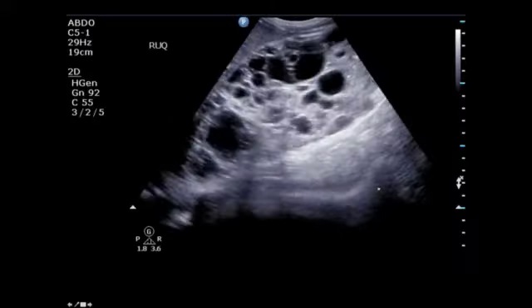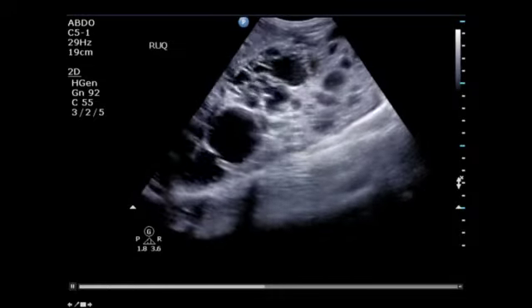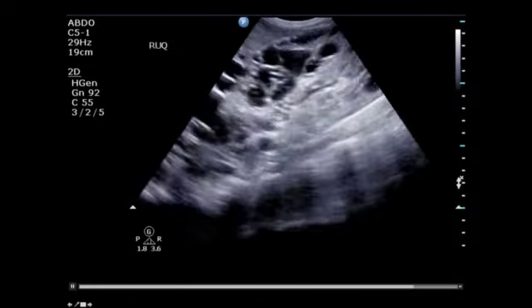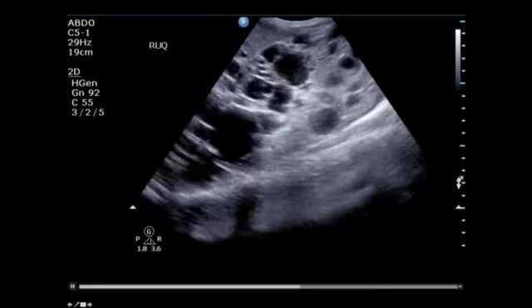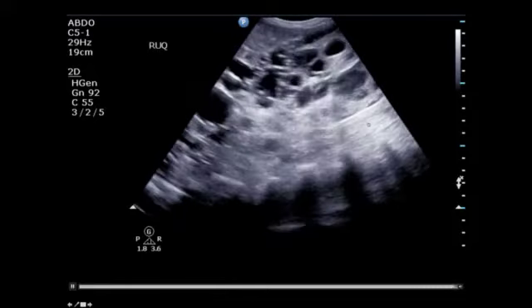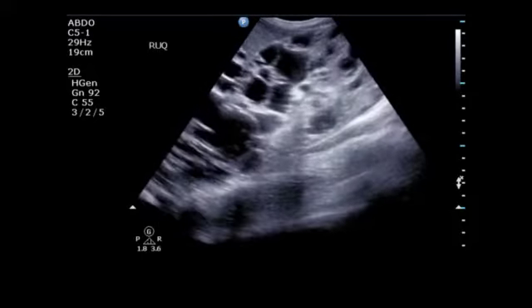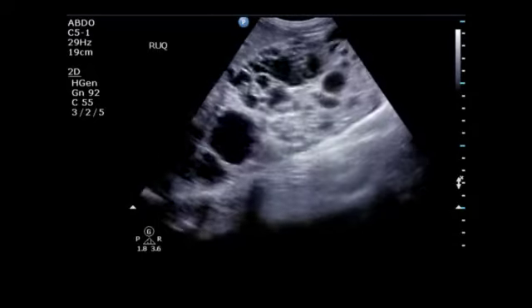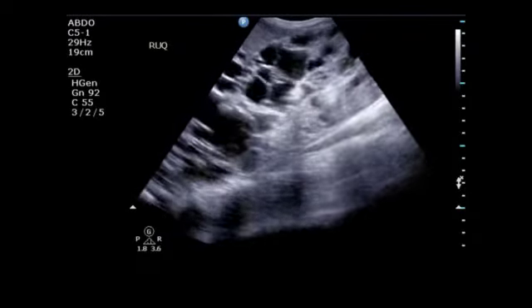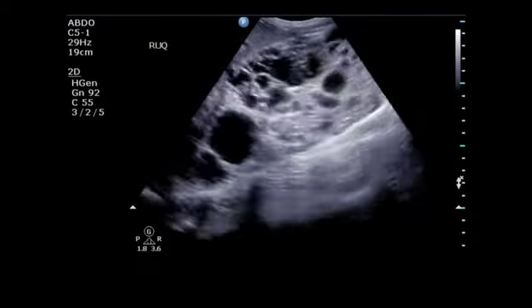And this case is one of polycystic kidney disease, where you can see the renal outline here, but there are also lots of liver cysts. So this is liver just up here. This is just riddled with cysts, and there's very little functional residual renal tissue left. That's polycystic kidney disease. So 1, 2, 3, okay. More than that, particularly if there's very abnormal looking renal parenchyma, think about polycystic kidney disease.